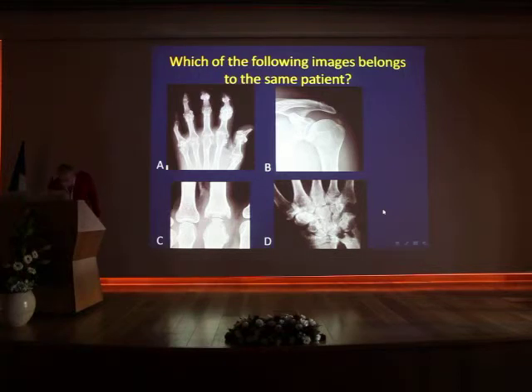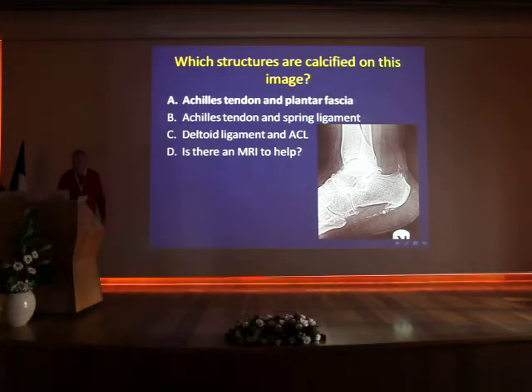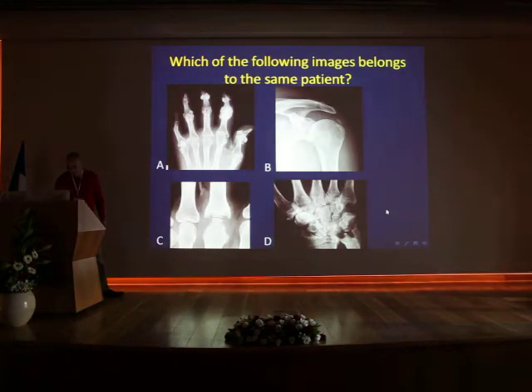Where is it? Previous one. Those belong to the same patient? A and D? Okay. We are not sure about it, because I thought it's B. The patient has leprosy.